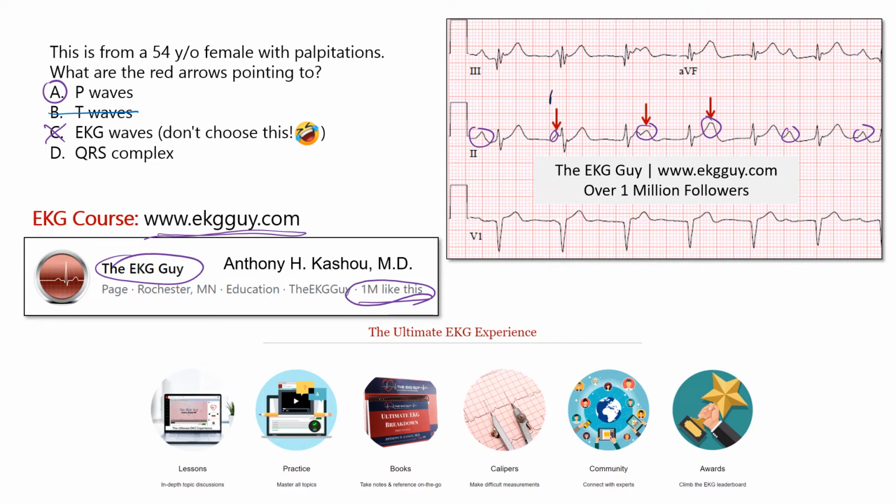Here's your P wave, okay? And here's your other P wave. So that's 2 P waves. But notice that you have 2 QRS complexes that are occurring within those 2, all right? And that's demonstrating that the ventricular rate is faster. And so this would be a case of AV dissociation, okay? And in the setting of AV dissociation, you then have to qualify what are the underlying rhythms, okay?